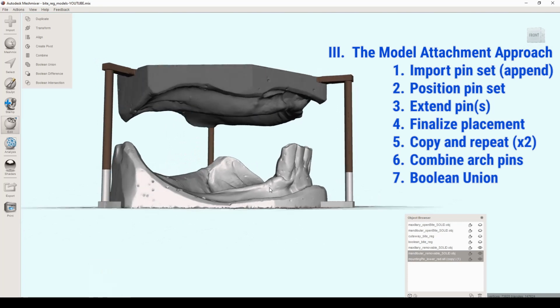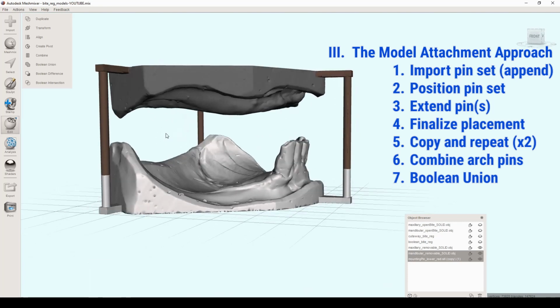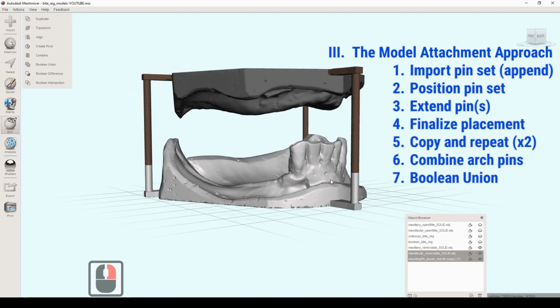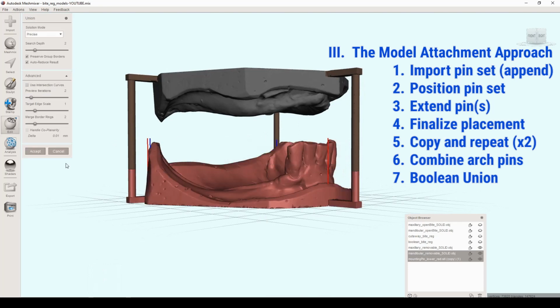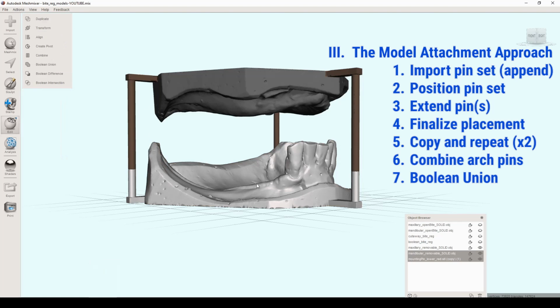So I'm just going to show you what I did and why it worked. I haven't done anything yet, but I already did, and then I undid it. So here I was, and I tried to union these things together and tell me it works right now. Okay, no. Cancel. Like I said, we had this error. Couldn't get it to work. We tried all the different options.